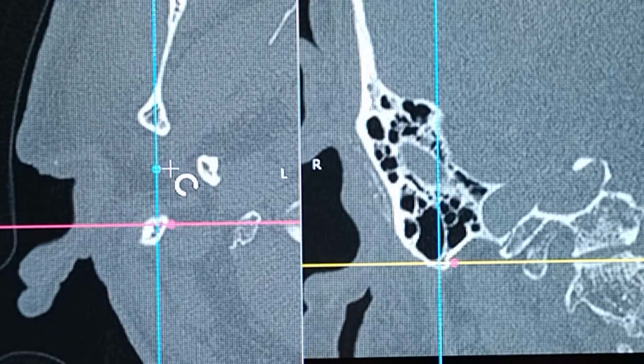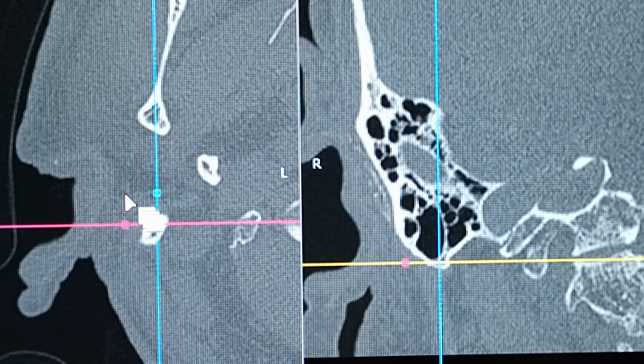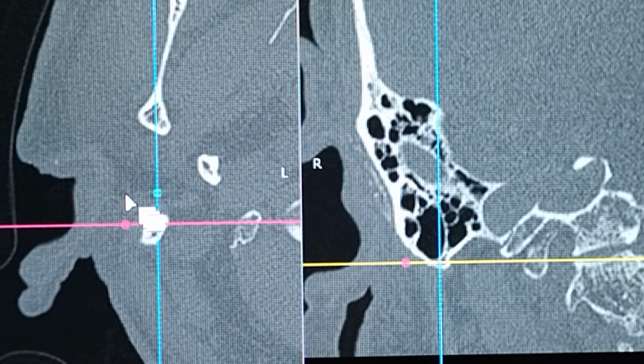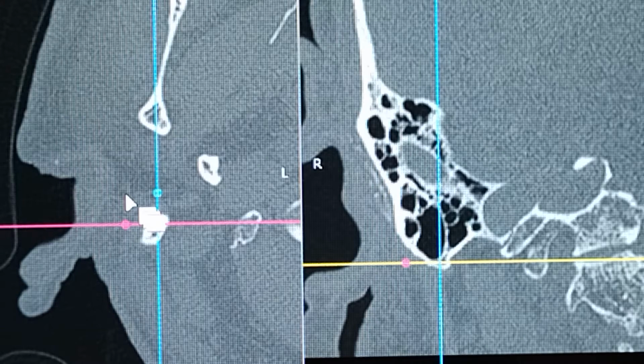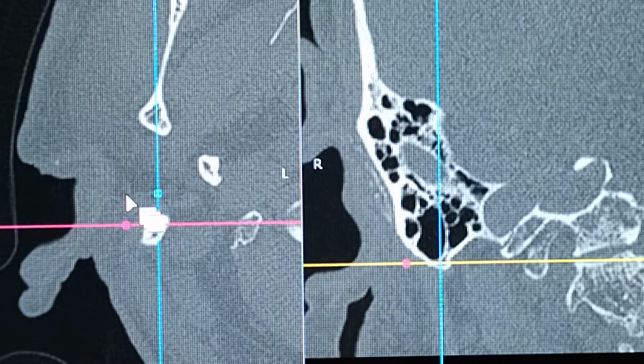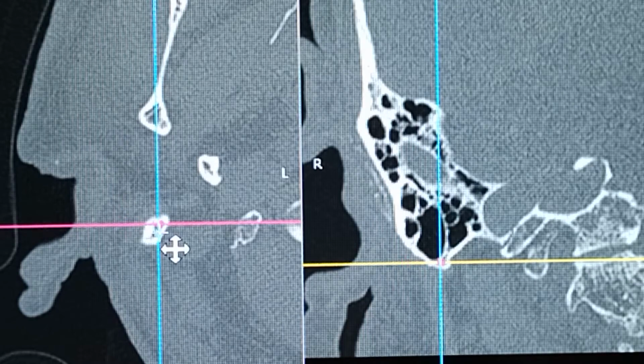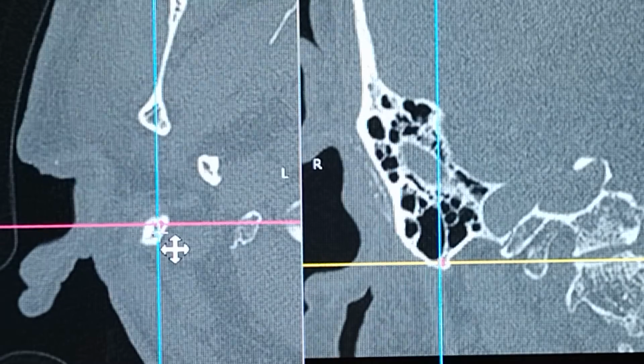So starting with the HRCT scan on the axial side, as you can see, I'm going from inferior to superior. Once I finish going inferior to superior, I'll show you how to identify and start reading a scan from the superior to the inferior as well, because both these directions are really important. Some prefer going up to down, some prefer going below to up. Okay, so I'm going to start the video going from the inferior to the superior aspect.